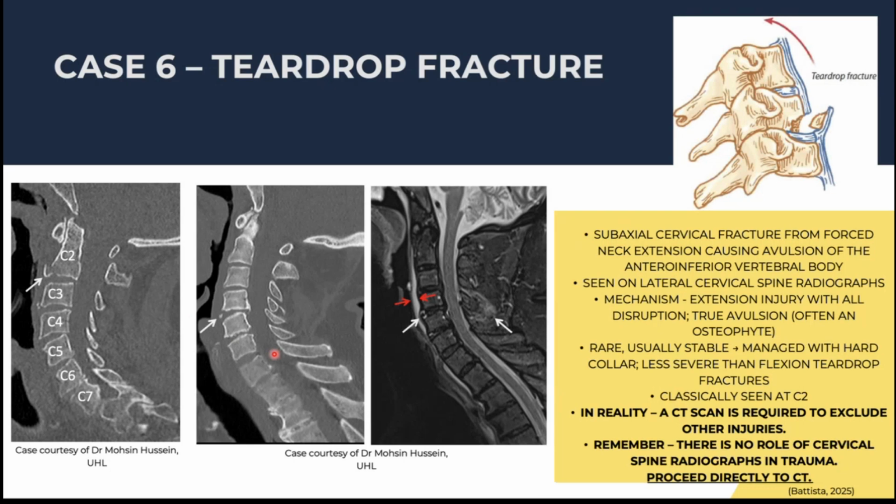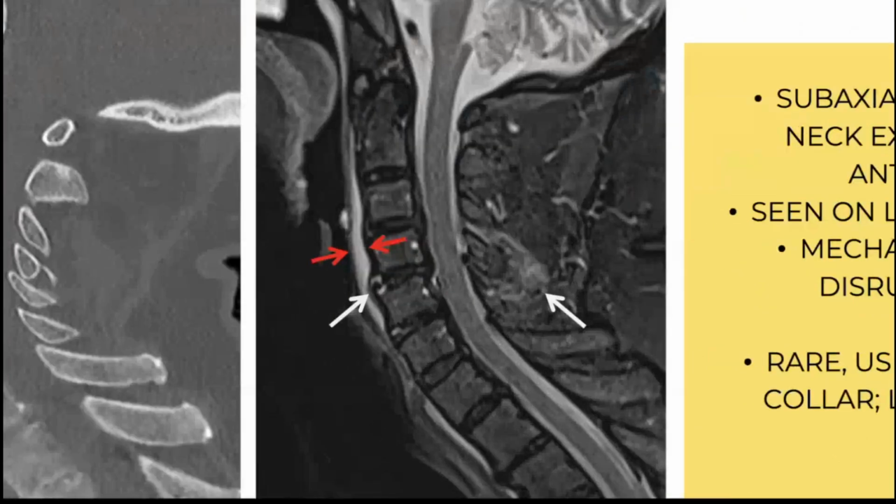And when we did the MRI scan, if you look at the red arrows that I've got, they're pointing towards a bright area, which is in the prevertebral space. This is the equivalent of your prevertebral thickening that you see on the X-ray. So again, what we spoke about, you have air in the oropharynx at that level, and then you have bone, and in between you have a thin layer of soft tissue.